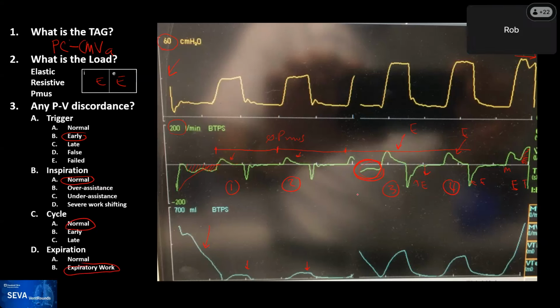So this is a complex image with a lot of information on it, but I think in general, if I was at the bedside, when you have these changes in tidal volume, the question is what is causing this delivery of flow to be impeded? And as Rob highlighted, the causes for acute changes in compliance are not many.